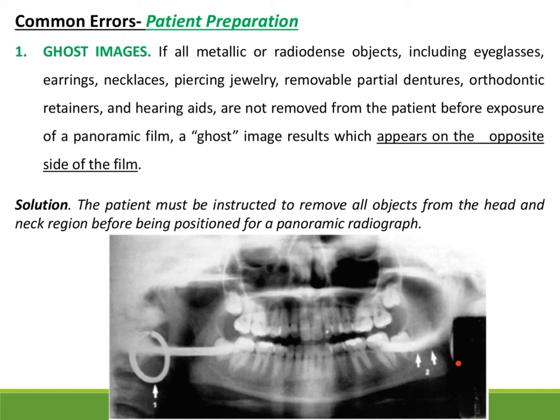So the artifact or the ghost image of the left side earring will be seen on the right side here. As you can see, the shape is distorted. So this object is not present in the maxilla or the mandible, but it appears to be there because you forgot to instruct the patient to remove the earrings.